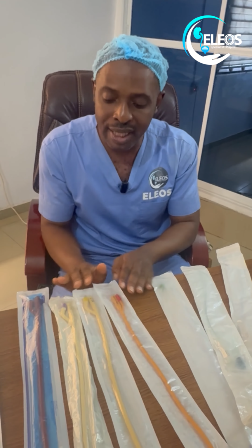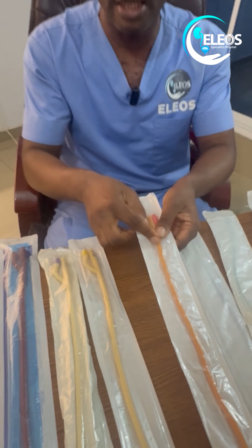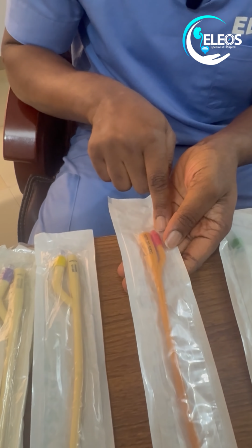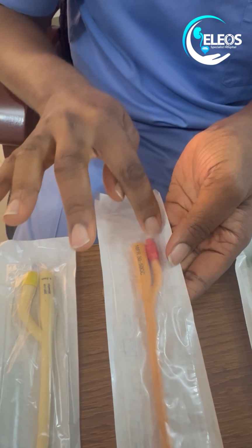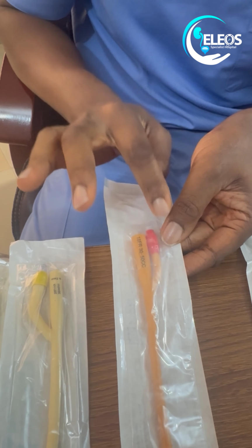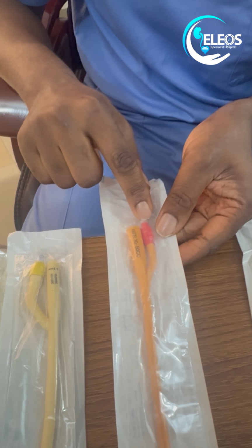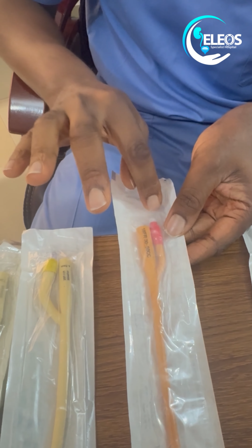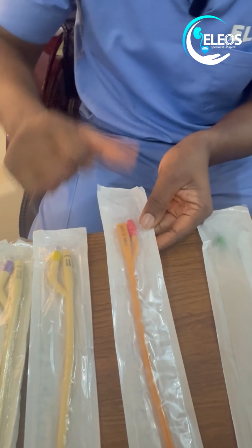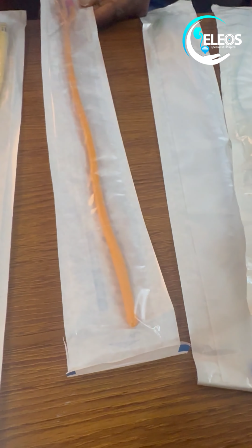Now, two-way catheters have two channels. Outside the normal channel where urine will flow out from, it has a channel for retention. Like in this size 18 catheter, the channel for retention is color coded red, and that means it's a size 18 catheter. You usually put fluid, usually sterile water, inside this retention channel to retain the catheter. When you inflate it, the balloon at the tip will swell up, which will now retain the catheter in the patient's body.